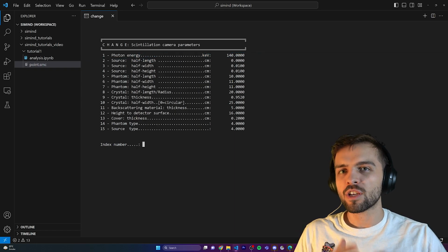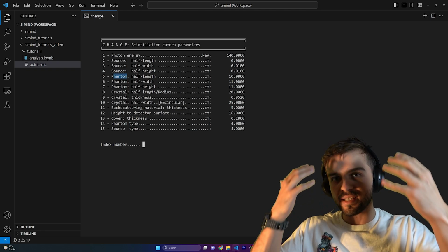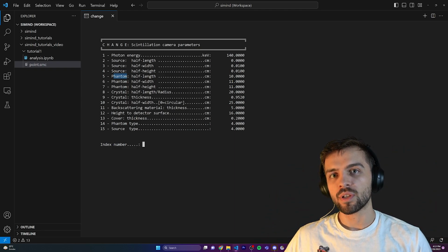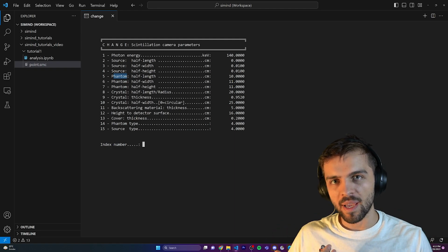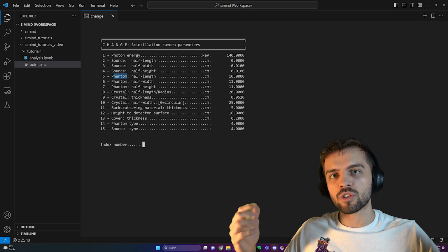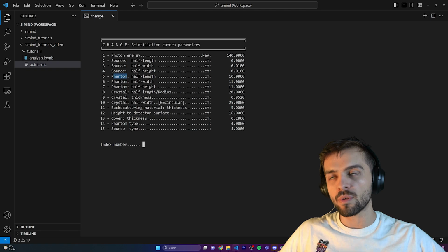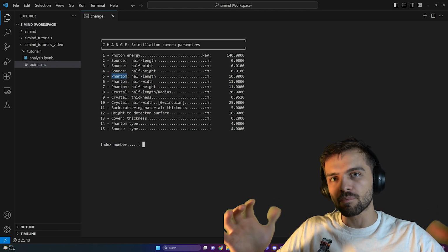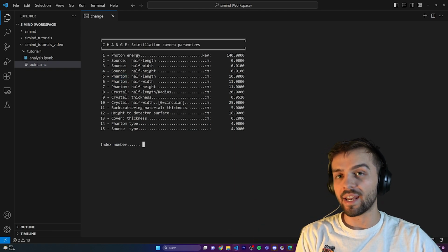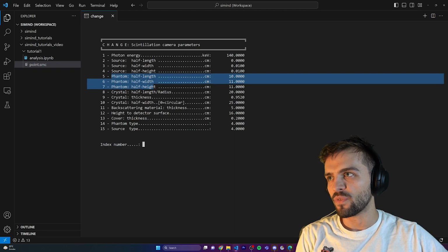So there's two main components in every simulation in SIMIND. There's the source and the phantom. So the phantom corresponds to the attenuation coefficient everywhere in space, or the Hounsfield units. It's like a CT scan. It measures the density everywhere in space, but more importantly, when you're simulating photon transport, it gives all the necessary probabilities you need to actually do a Monte Carlo simulation. So the phantom contains the density or attenuating properties of the material at every location in space. So you simulate a photon, it goes throughout space, and it's based on the phantom here.